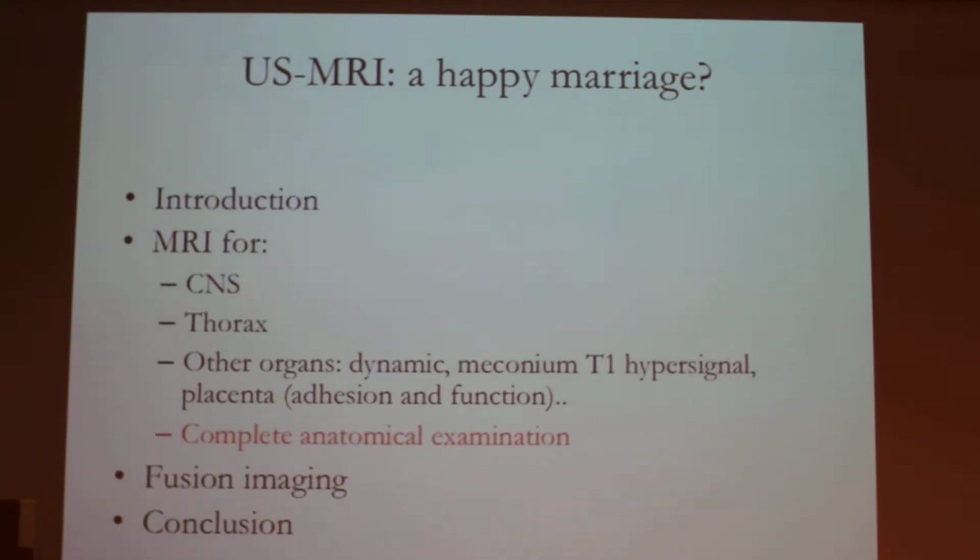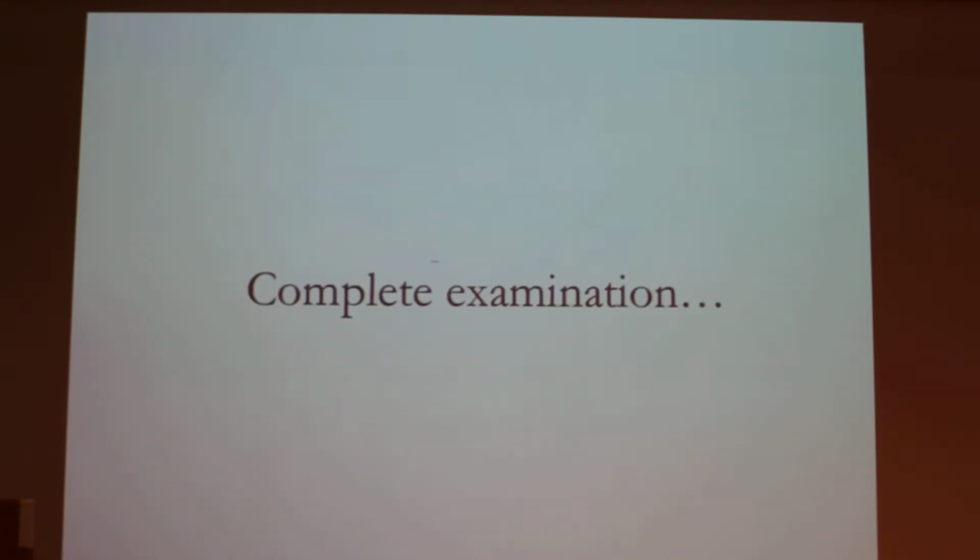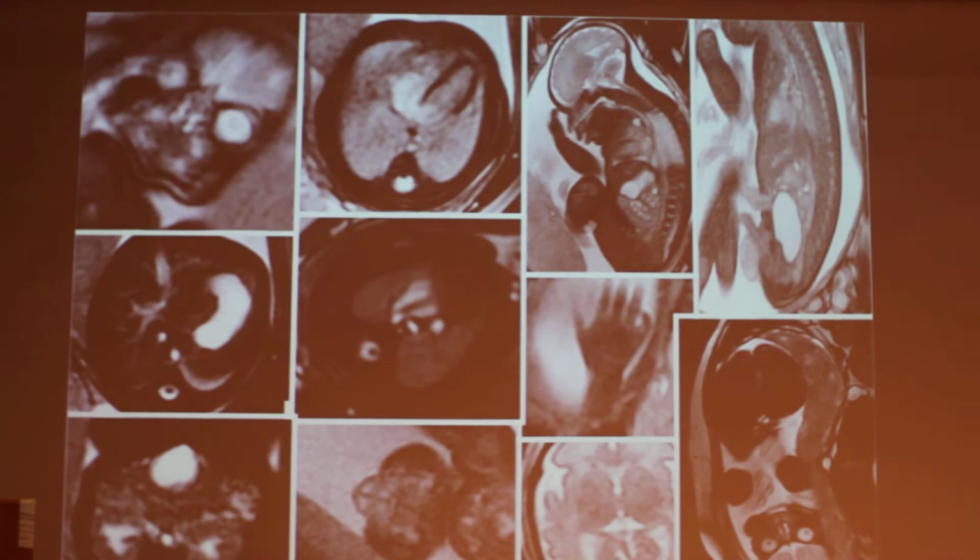As you can see, you can have a complete morphological examination of the fetus with MRI, and this is something we're working on, especially for obese women. You can use MRI to assess the entire normal anatomy of the fetus, and this is a work that has been published in Radiology, where she demonstrated based on 100 cases that MRI can be used as a reproducible means to assess the normal development of the fetus, and they were able to complete a normal morphological examination based on the ISUOG guidelines in 100 MRI examinations.